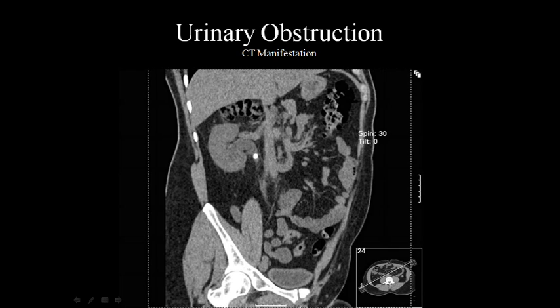Here we have hydronephrosis or hydropelvis. Look where the stone is located. And so if we go by this reference image here at the bottom, we see that they have basically obliqued this patient so that we can see the kidney, and then we can see the renal pelvis and the UPJ. And so this is around the UPJ, where the renal pelvis is actually becoming the ureter. And so right here we have a blockage, which is causing a difficult time to actually go through.